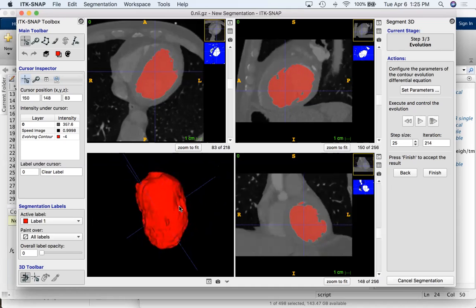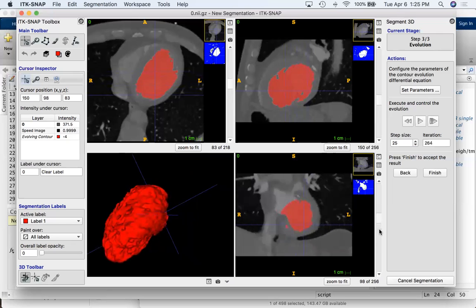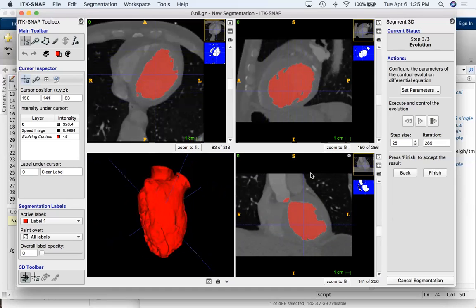We've sort of filled out the ventricle. But let's do another step. And you saw the apex got bigger, right? So we're probably not completely finished at the apex. Do another step. Oh, it grew a little bit down at the apex. So if we go here, oh, it looks like it's pretty full. Yeah, in my case also it's kind of full. Okay, it doesn't really matter if you keep going because it just grows stuff out the top. So now it's just gonna grow these things every time I hit go. So it grew these little mushrooms. And then, so we're fine. So that's our 0th one.